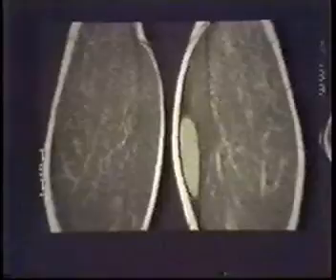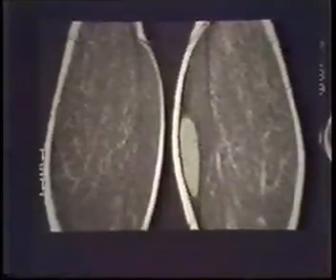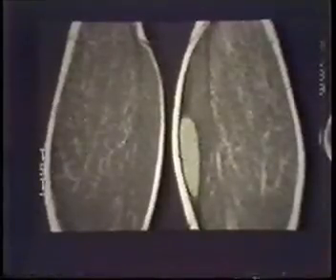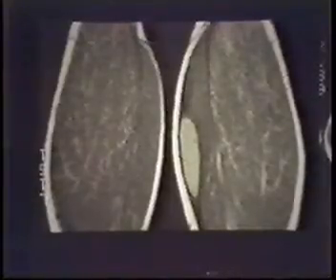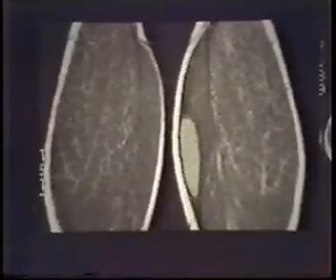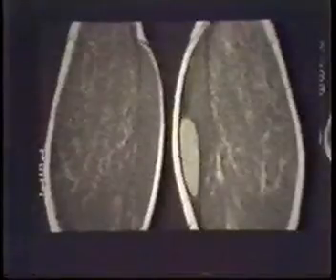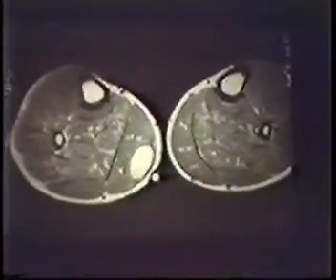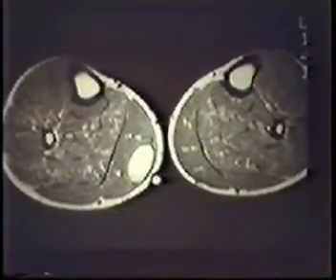Now I'd like to get a little bit away from these, and this is something that we've seen a lot in Southern California as well as elsewhere in the country. People like to run a lot. This is a young lady who's just started running and decided to run more than she should when she first started out. Developed severe pain and weakness in the distribution of this abnormality. Surgeon was concerned about a rupture of a muscle and whether he should operate. This is just a typical intramuscular hematoma, and the important thing is that these heal fine on their own. Just keep the surgeon out.